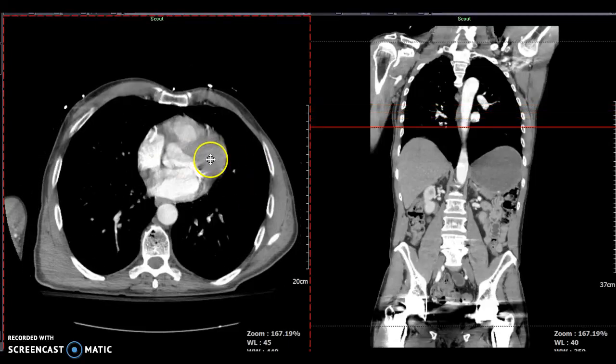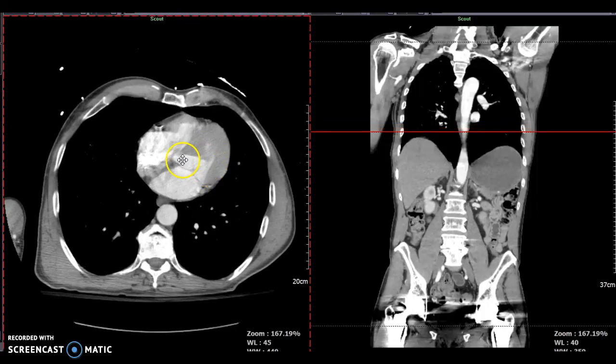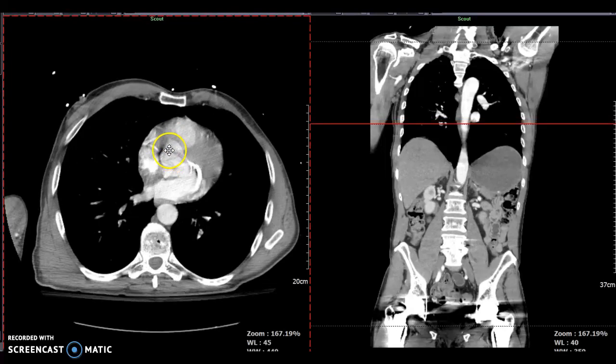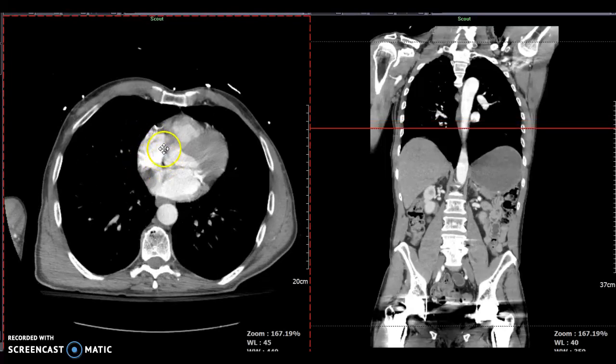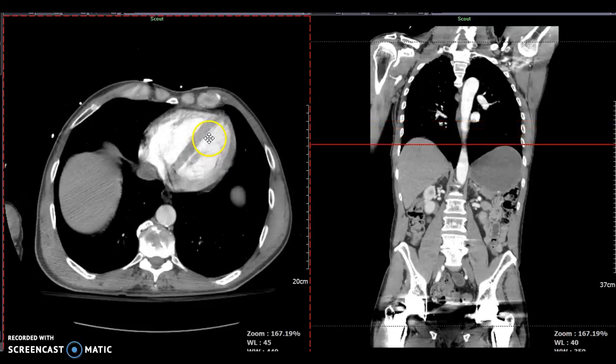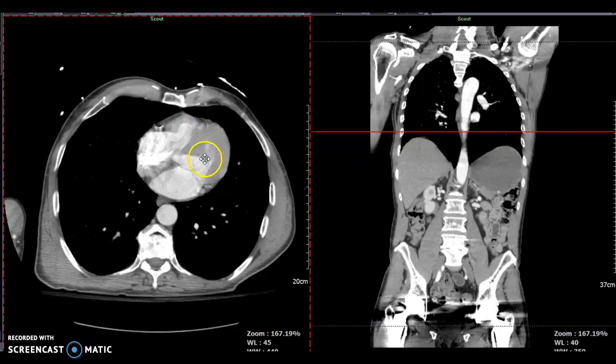All right, so we got the heart right here, obviously. It's a nice shot of the left ventricle right here. This is the left atrium, the most posterior chamber. This up here is the right ventricle. That is the most anterior ventricle chamber. And you have the right atrium right here. Know those chambers. The left and right ventricle are separated by the interventricular septum. You need to know that.